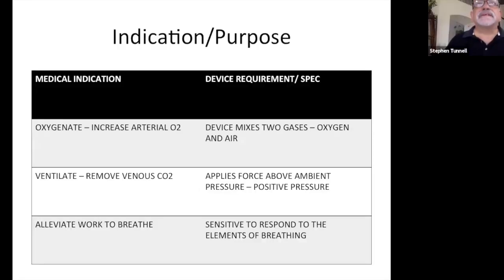What I have this morning is a PowerPoint presentation, and then I've hooked up another computer that has our ventilator simulator on it so that we can switch screens and actually walk through the inside of the ventilator. Okay, so let's talk about ventilators in general.